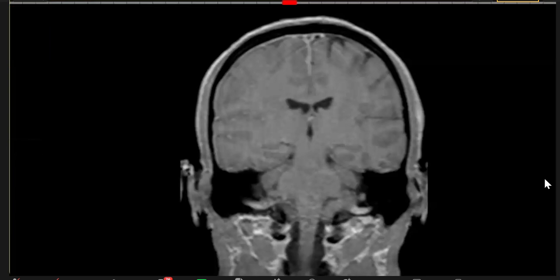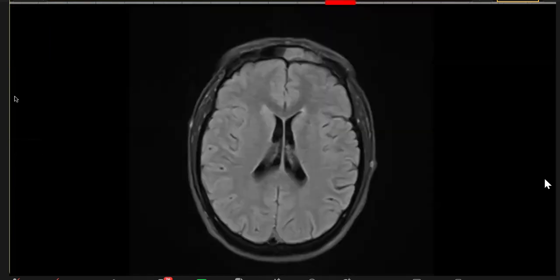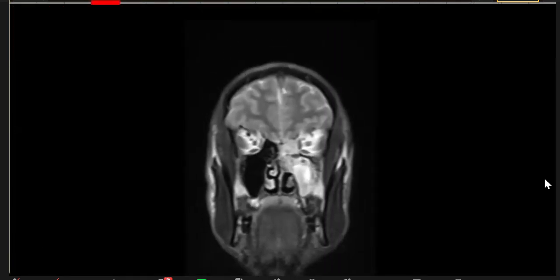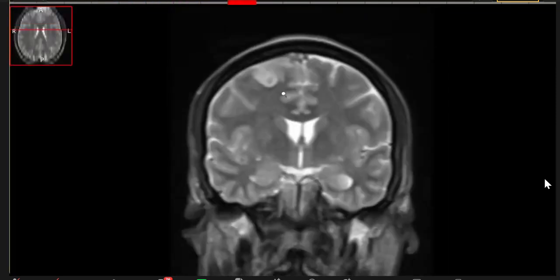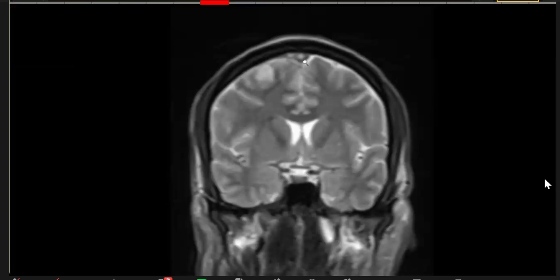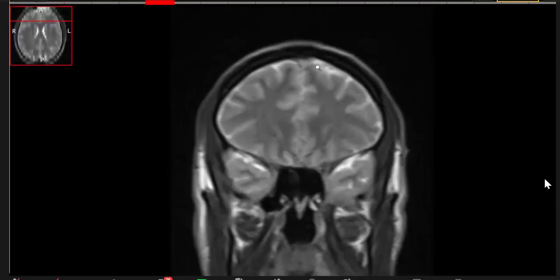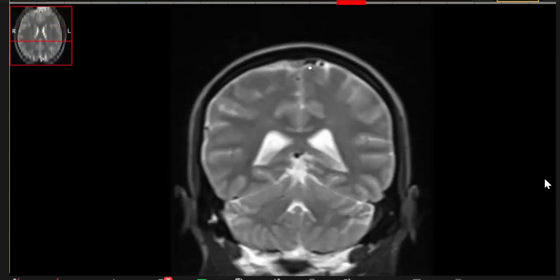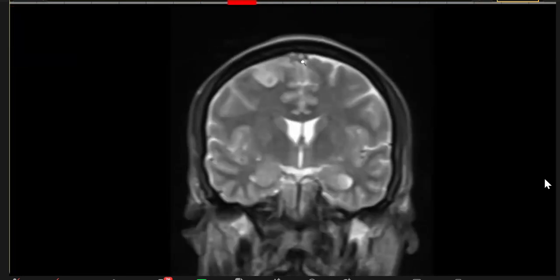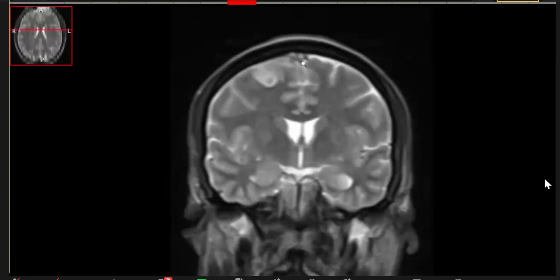Just to show you, let's go back to the previous sequence. I did not show you a T2, but develop your eyes on a T2, where normally there is a signal void. From tomorrow, start looking at the T2 coronal in your day-to-day reporting, and you will see a signal void. Of course, I did not show it to the candidate, but just for teaching, this signal void is lost, and on post contrast it was very obvious.